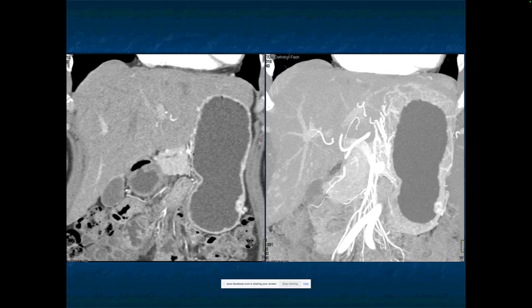Well, vascular lesions, it could be a cancer, but usually adenocarcinoma is not vascular. Same thing with lymphoma. Small GIST tumors or leiomyomas can be vascular, but this is a bit more vascular than even that. Neuroendocrine tumors are vascular, so it may be a carcinoid of the stomach. Occasionally you can see mets like renal cell or melanoma go to the stomach and are very vascular.